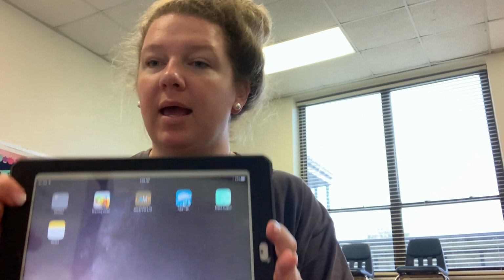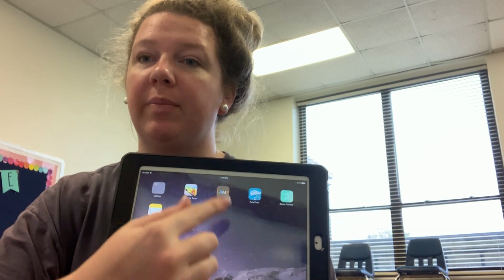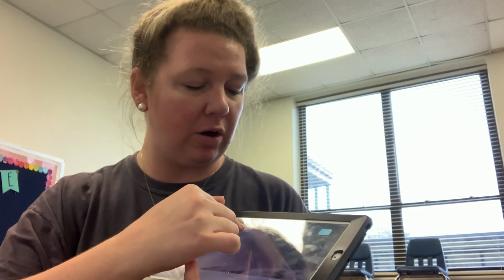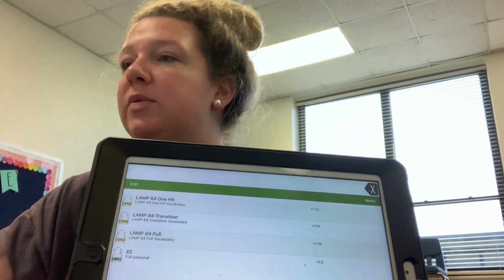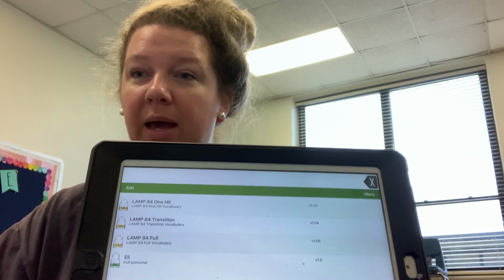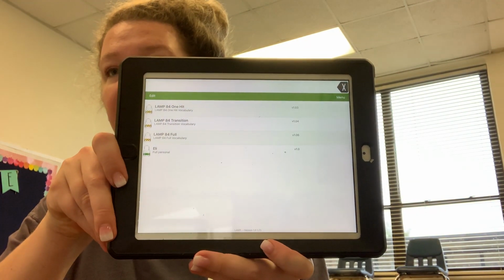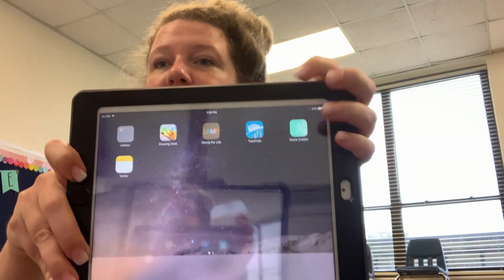Hey, so today I'm going to be talking about an assistive communication, AAC, device or program that you can get on your iPad called LAMP, and it's called Words for Life, and it is designed for students with autism. You can download it on an iPad, and when you first open it up, of course I just showed you this, but this is what it looks like, the app.